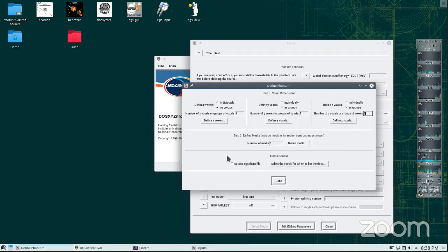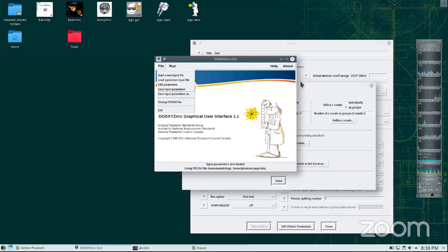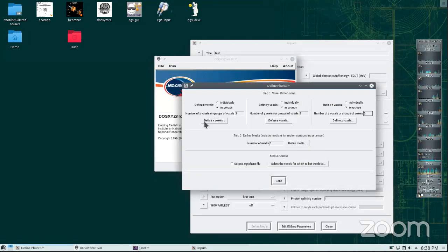After I've entered these, let's see if it'll allow me to save. I'm a saving freak. Always when I do something, I like to go and save. So let's calculate the number of boxes in each direction. That's important. Here we have 82, this one we have 82. How about here?